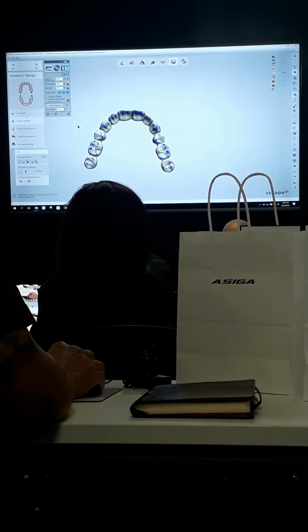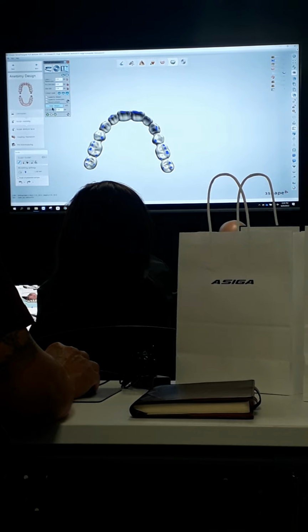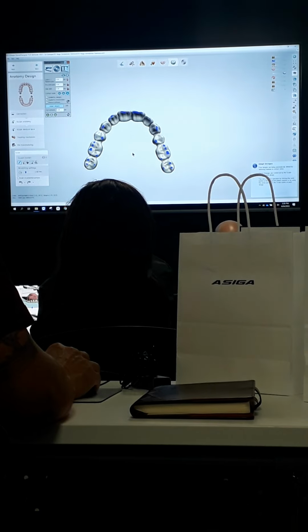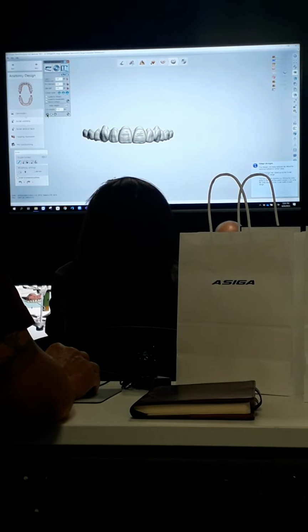That's why it's really important that you check these in the first step where we set the teeth to make sure it's close, and then you just do this a couple times and that will equilibrate everything together. So I'm going to adapt it once, and then I'm going to check it.